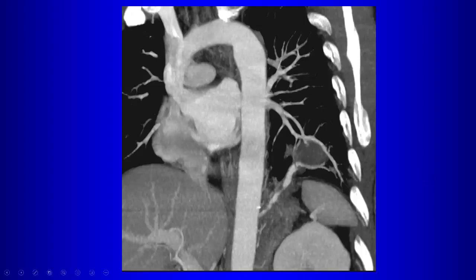It's more like higher likelihood of being intrapulmonary. Both of them have systemic feeding. That's what you look for to make the diagnosis of sequestration. Systemic feeding. Well, what do we see here? Oh, a connection to the tracheobronchial tree. That's not what we're showing here. What are we showing here?